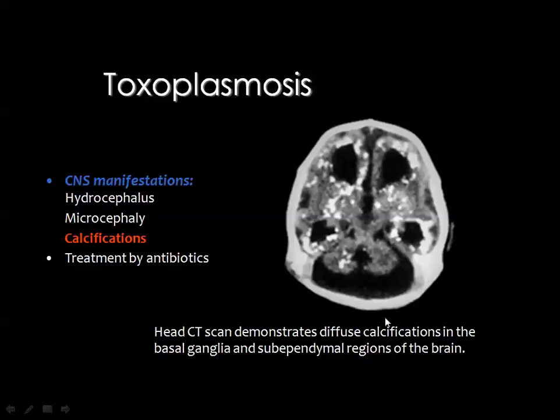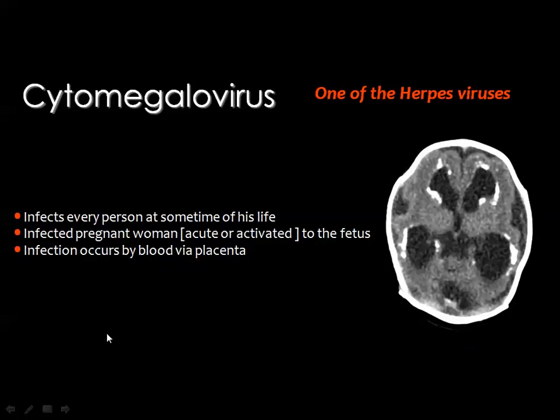You can also appreciate that the skull is relatively small, and there is a Dandy-Walker malformation in the posterior fossa in the form of a big retrocerebellar CSF containing cyst, which is communicating with the fourth ventricle through the aplastic vermis, as I have mentioned before in the lecture of hydrocephalus. And this protozoon is treated by antibiotics.